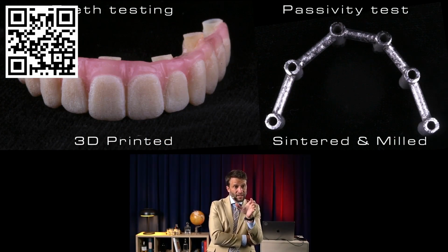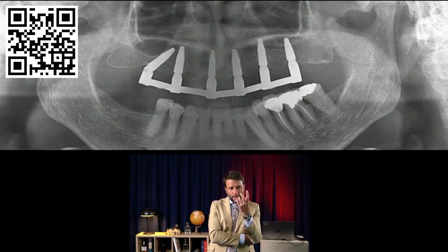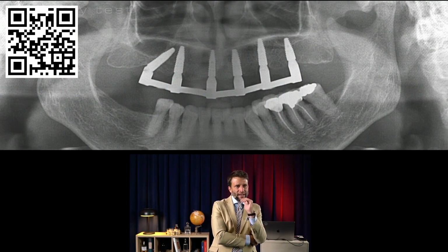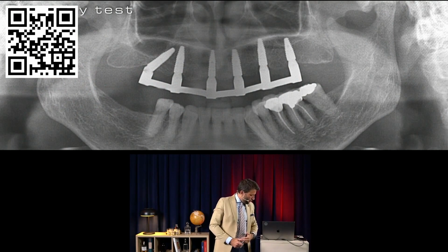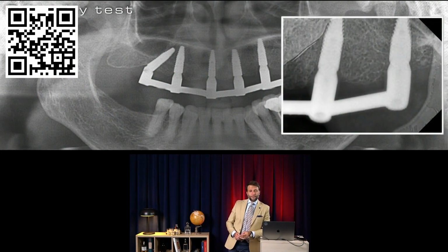Nowadays, we can even print these passive fit tests in a rigid resin. But this is just to show how the complete digital workflow is actually working in terms of precision and passive fit. Especially when you work with systems like the PIC system, that is an amazing system for scanning multiple implants, okay? Look at the fit.